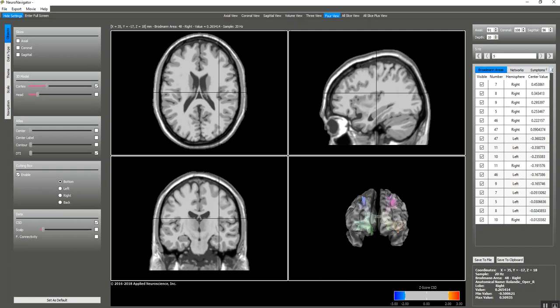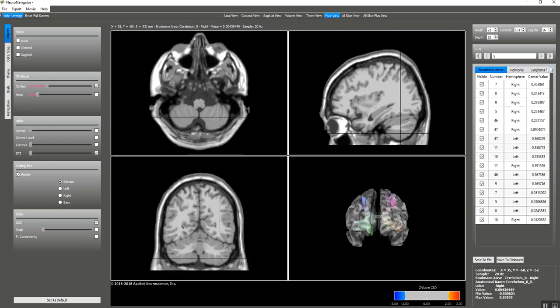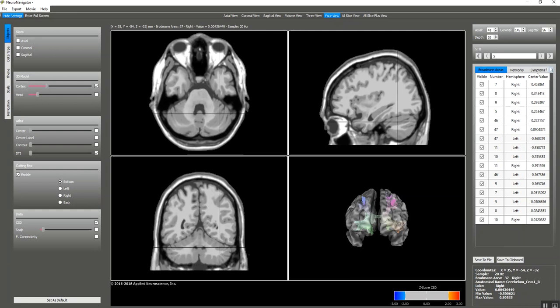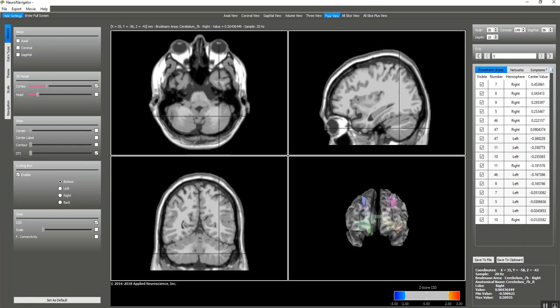SW LORETA. And in the future, we are going to be looking at the cerebellum, looking at sources, doing experiments with the cerebellum. You can see the left and right lobules there. The vermis of the cerebellum is here. And we're going to be looking at left and right limb movement, leg and arm, and balance changes to try to verify the source changes inside the cerebellum.